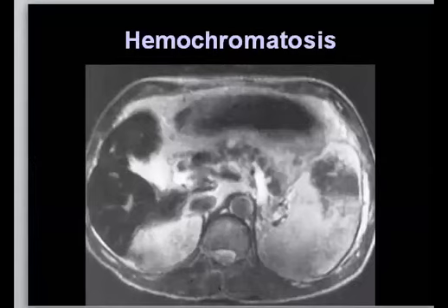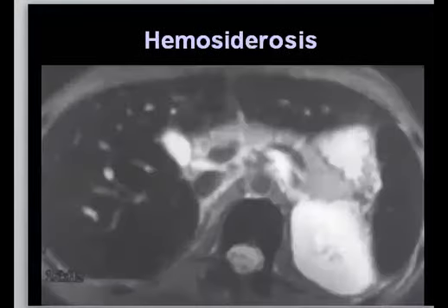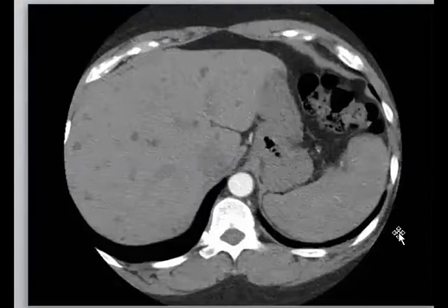We talk about it, and we say that the pancreas is primary and the secondary is the spleen. So you should look in the spleen. Yes, again, hemosiderosis, and here you can see that the spleen is affected. So is it primary or secondary? Secondary. Nice. Welcome.